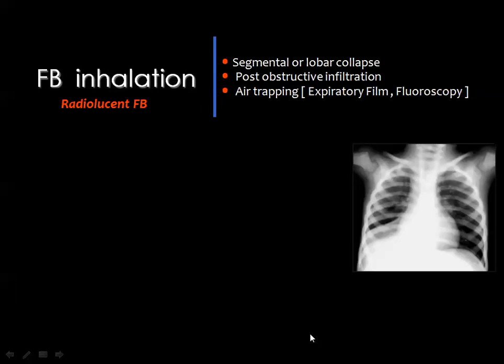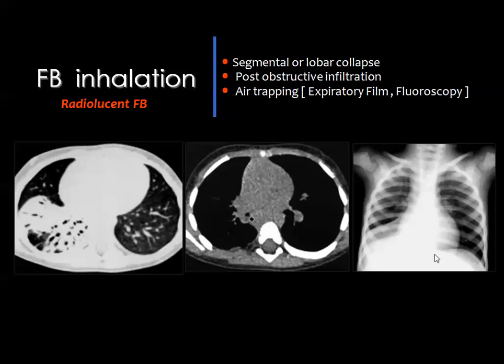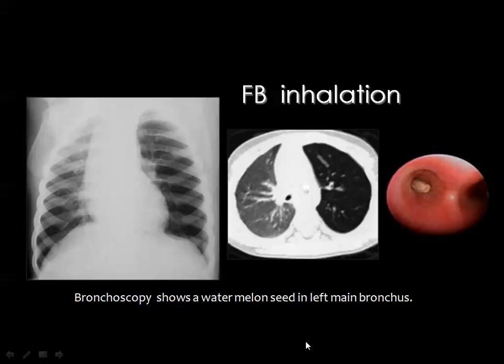It does not collapse during expiration, raising the possibility of an inhaled foreign body. And then you can also detect a consolidation, as you see in this plain X-ray, where you see an opacity in the base of the right lung, and this is the opacity seen by CT scan, and this very small arrow points to this hypodense foreign body impacted in the lower lobe bronchus. Sometimes you can see the foreign body, sometimes you cannot see it even by CT scan.